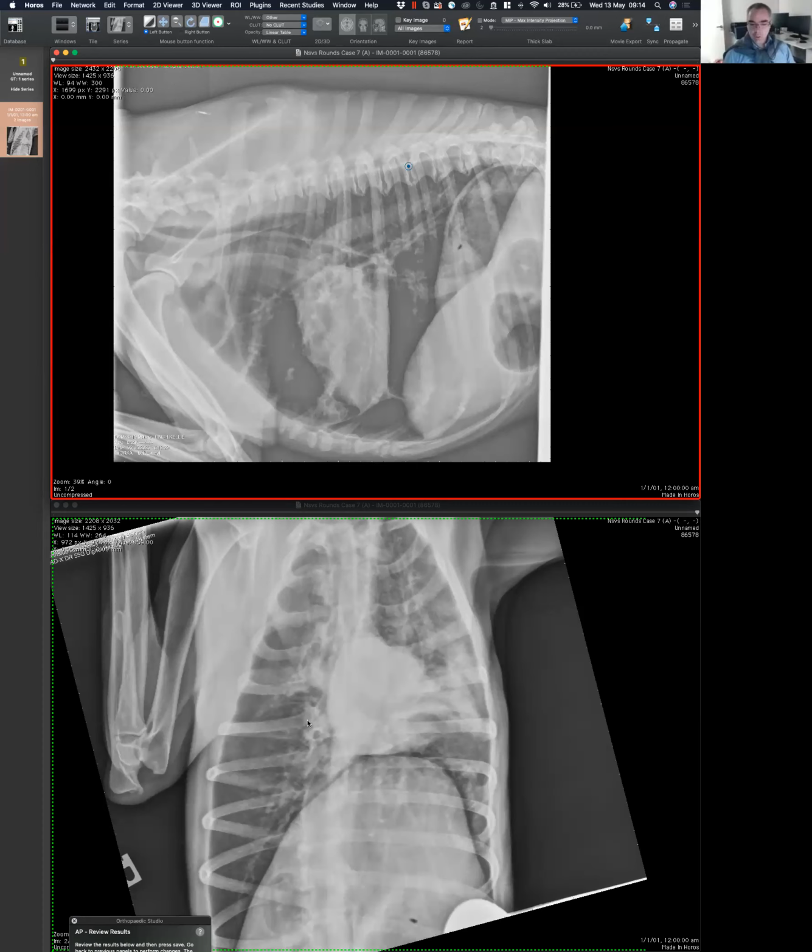So are you talking about this? Yes. Okay, good. So I agree that looks like the wall of the bronchus. Mariano, Helen, you are also talking about the lung. Do you? No, I'm sorry. Helen is writing something here on the chat, and it's similar to your comment.